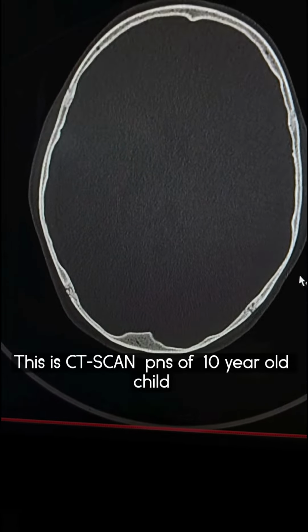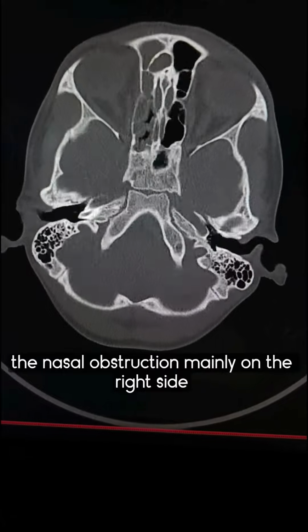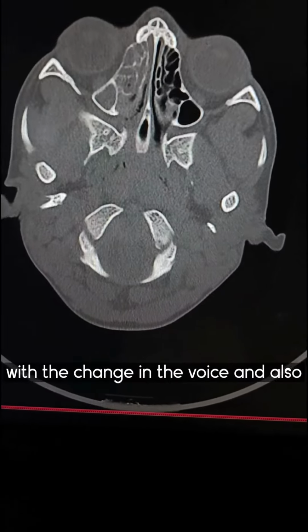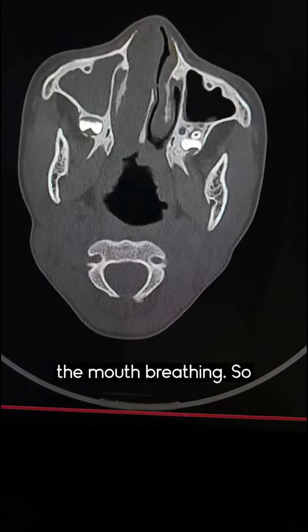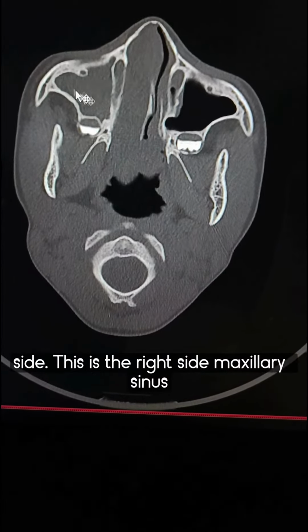This CT PNS of a 10-year-old child came with a history of nasal obstruction, mainly on the right side, with a change in the voice and also mouth breathing. So this is the maxillary sinus on the left side. This is the right side maxillary sinus.